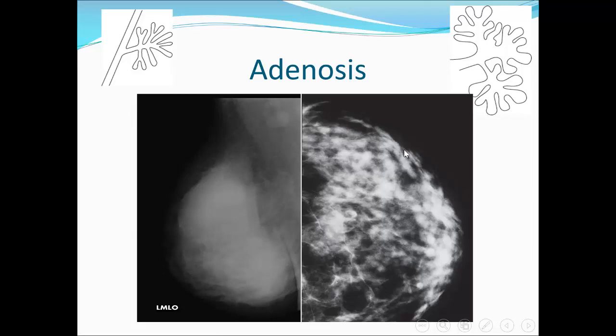This adenosis: when to report adenosis? Not all mottled breast is adenosis. If you have a mottled breast and the patient has no complaint at all, then it is normal, since there is no architectural distortion and no abnormality. If the patient is young, the appearance may be like that.